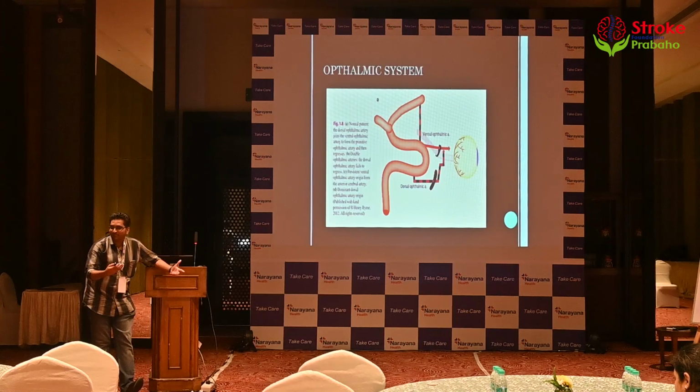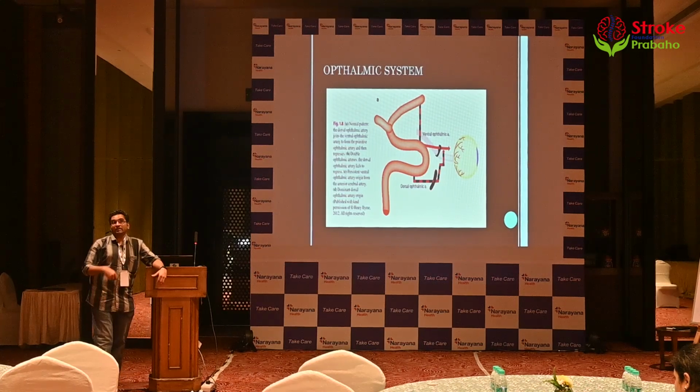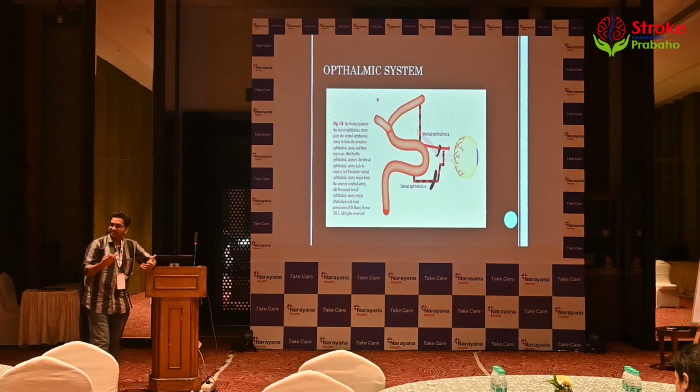No, I have seen people telling it. I use ophthalmic as a landmark. I think by that they mean a normally placed one. But even that normally placed, this is not abnormal. These are just embryological variants. No, it's not abnormal, 90%. It's not abnormal, but the majority location of the vessel is.